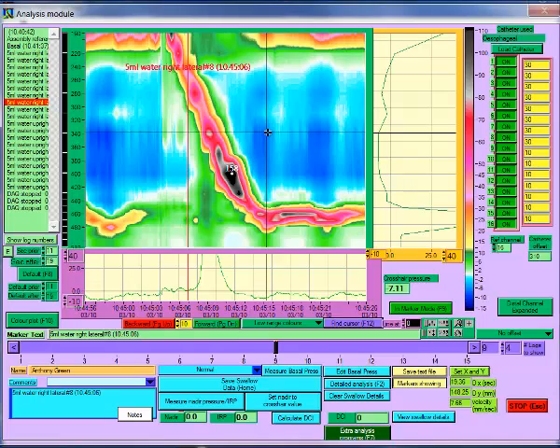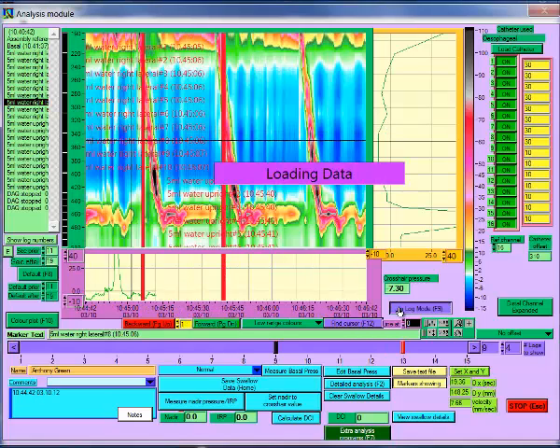The alternative to marker mode is data log mode. In data log mode, a specific number of data logs, which each consist of 30 seconds of data, are displayed. The position of the data within the file is displayed in the purple bar below the graphs. You can change from marker mode into data log mode by clicking on the button marked In Marker Mode, which will change to In Log Mode.